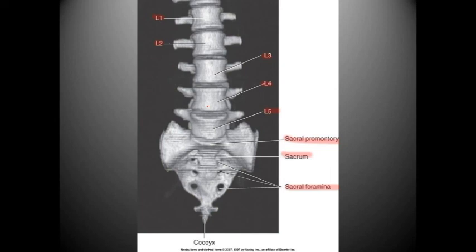So, as we know, 3D reconstruction has kind of been called on in terms of looking at the spine. And so we start by labeling L5, L4, L3, L2, L1, and sometimes volume rendering is excellent, sometimes volume rendering is not.